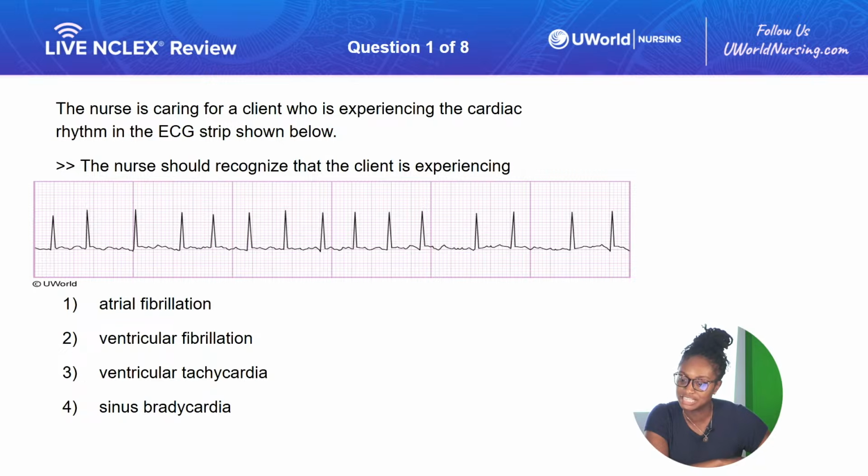Lots of good answers in the chat. This one seems pretty unanimous. Keep going and dropping your correct answers in the chat. And then I'll give you guys some hints on how to kind of recognize these rhythm strips, what I go through, my little step process. Good job, guys. Good job.